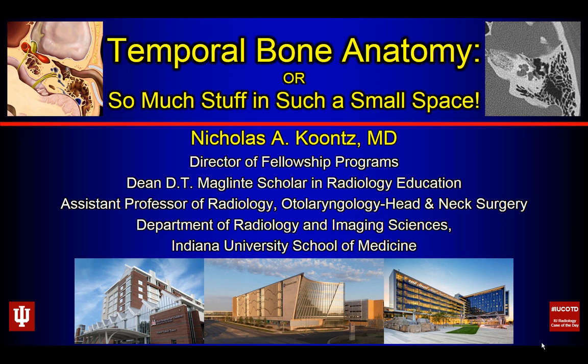So this talk is going to be on the temporal bone, and it's going to specifically deal with temporal bone anatomy. And I have an alternative title for this talk. I call it "So Much Stuff in Such a Small Space," and that's because the temporal bone is a pretty small structure. I mean, we're talking about something that is, in general, on each side, somewhere around the size of a stack of playing cards, a deck of cards. But contained within that, there's really a lot of stuff going on.